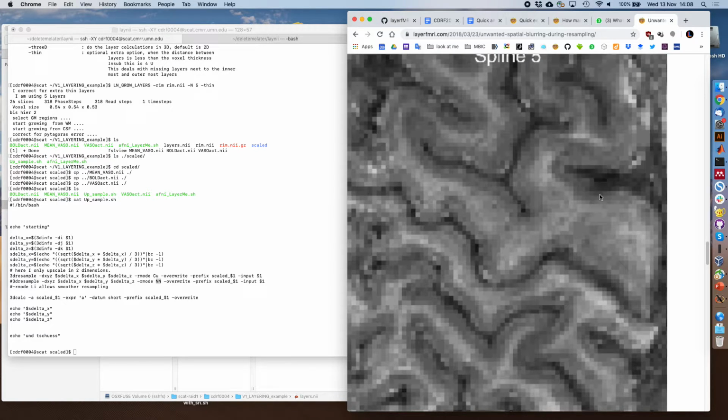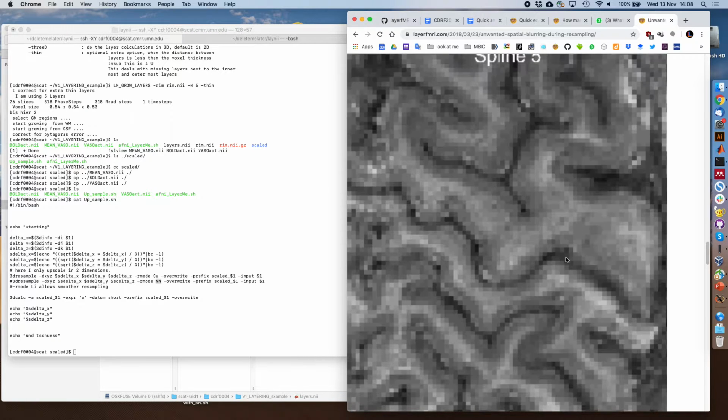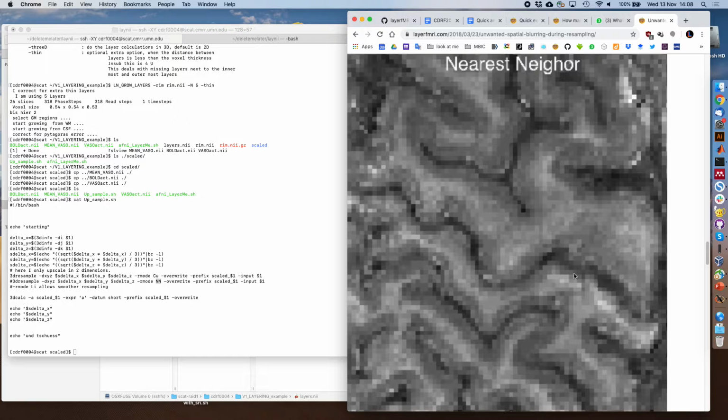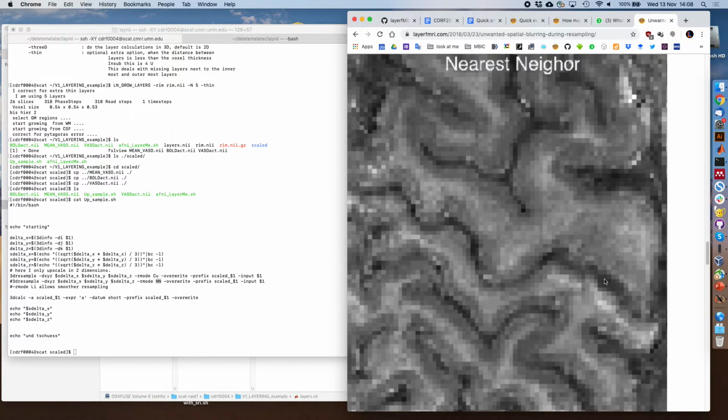Maybe you can see it, I'm not sure. Here, you have a step between one slice and the other, and so it puts some weird edge into this sulcus that was not there originally. This makes me afraid of using nearest neighbor.